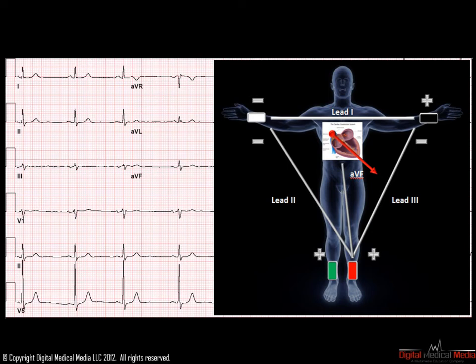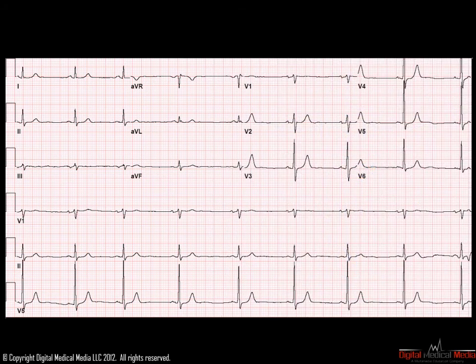The sinus node complex is approximately 1.5 centimeters long. P waves which come from the lower part of that complex are generally slower. Sometimes P waves originating from the lowest portion of the sinus node complex can have an inverted appearance in lead 3. They should still be inverted in AVR and upright in leads 2 and F.